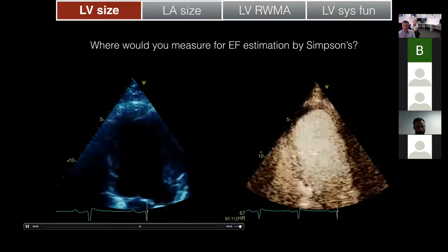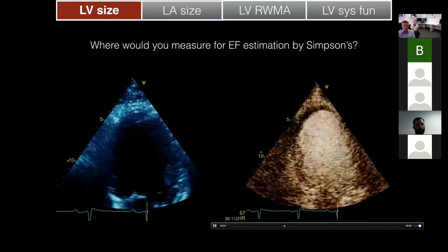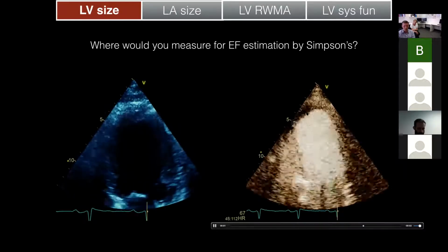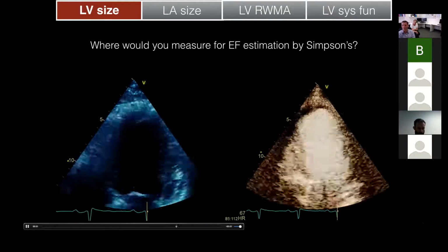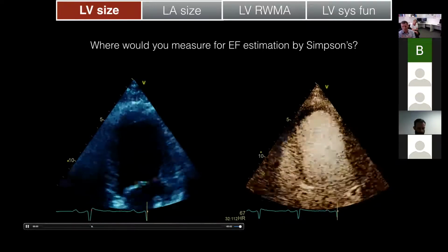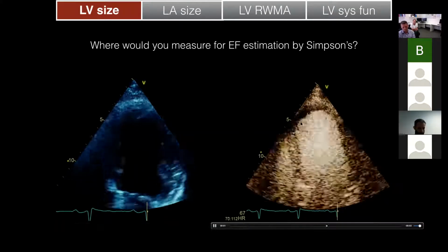If you've got contrast, absolutely you can do it. You can see a beautiful endocardial border definition. And what looks like up here is we're probably dealing with some form of thrombus sitting up here. You see this big black mark up at the top here. We are missing that when we're doing some of our dodgy imaging in our critically ill, or when we can't get good pictures. Often, I think you'll find a lot of thrombus if you go looking for it with contrast.